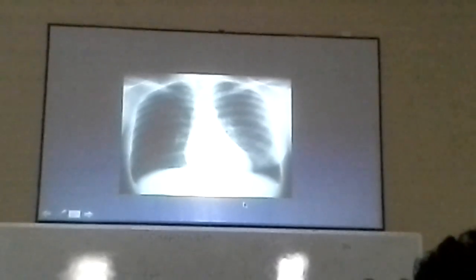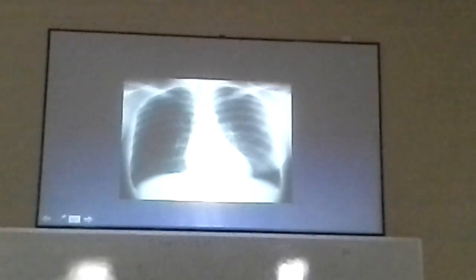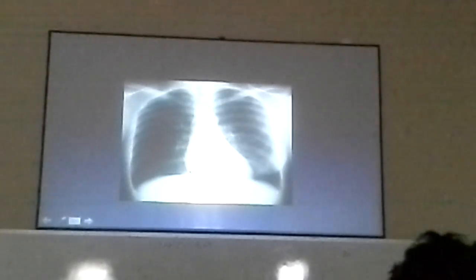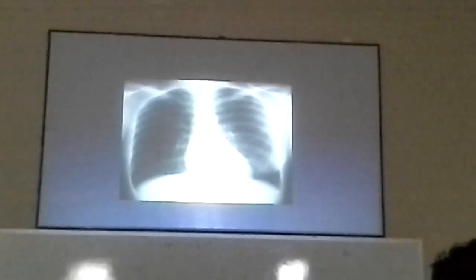Yes. Emphysema. Anyone else? Yes, what is your diagnosis? Very important X-ray. Mastectomy. So, right mastectomy. Due to mastectomy, this appears. Always see the breast shadows. A lot of patients, I told you, the number 2 cause of death in females is breast carcinoma, and in hospital you will see a lot of patients with mastectomy. Anyway, this is mastectomy, this is not emphysema. Emphysema is more flat.